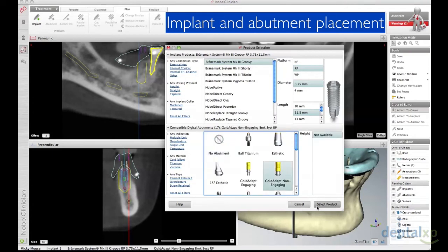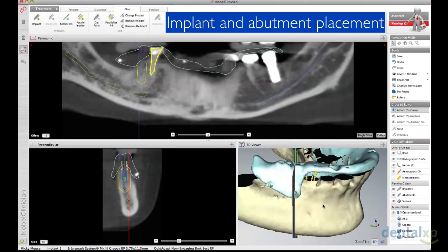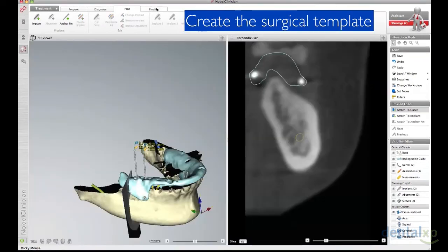If we look at the different abutments here, see the position, and look at the long axis, we make sure that we're not touching any adjacent roots or anatomical structures such as the mandibular canal, and we're able to now move this also in three dimensions.